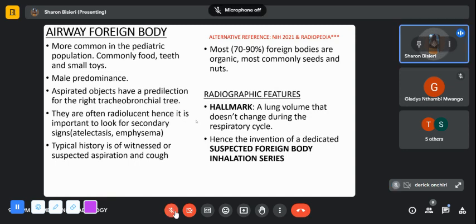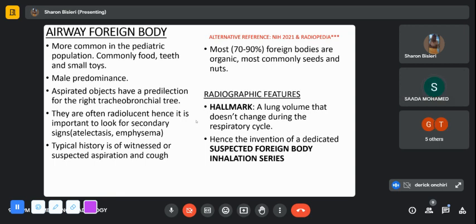Yes, there was a filling defect from this. I don't know how exactly they manage it, but we pointed it out. About that filling defect, I was trying to figure out how it arose, because from the 3D recon images, was there anything extraluminal, or was it just involving the adventitia?